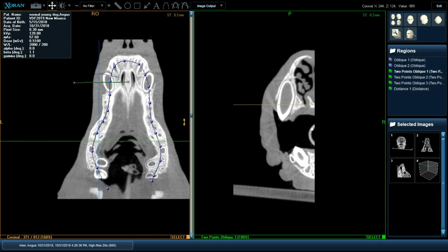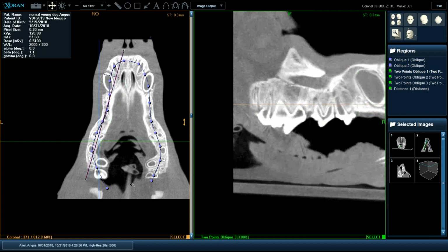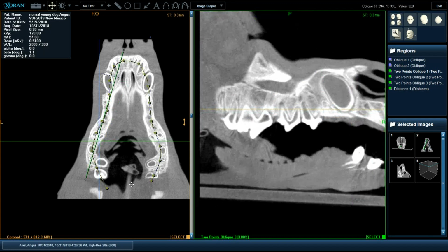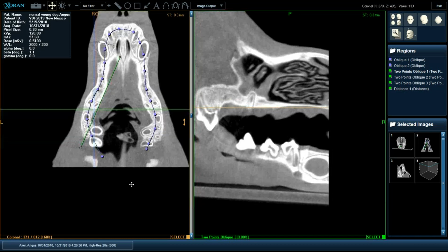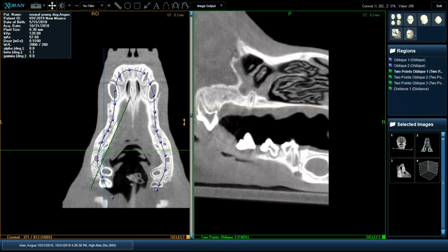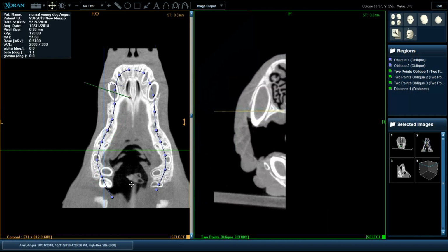In fact, we can make a cut of an entire arch as well if we wanted to. So if I now take a cut of the left portion of the arch, I now have what almost looks like a side projection of these teeth as well. So we're completely free to make cuts of roots in particular in any way, shape, and form we want to.